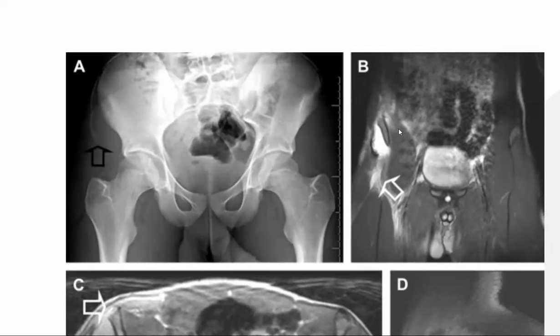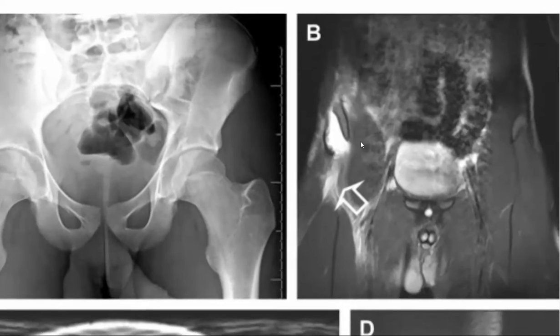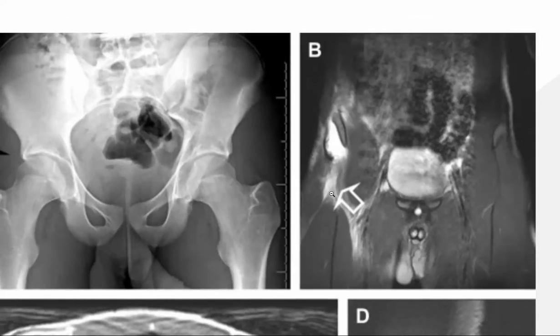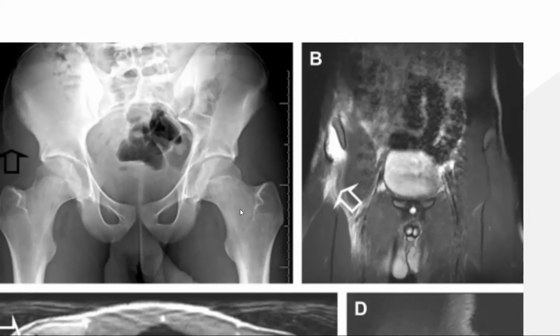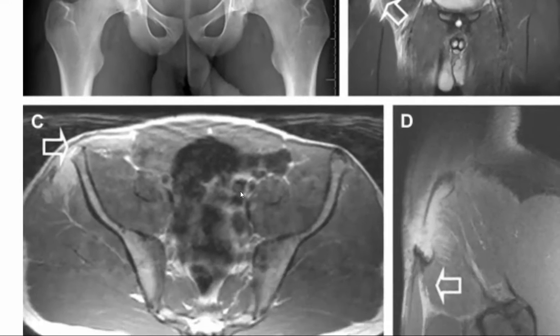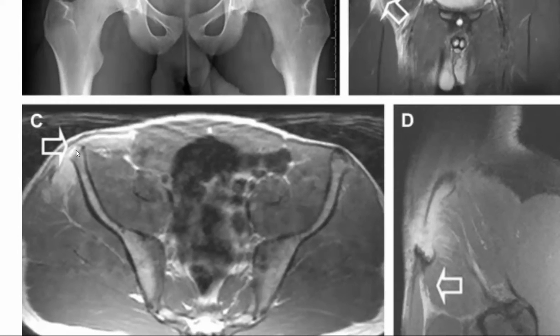So we MRI'd this patient, and you can see quite clearly how there's a large fluid filled gap, and there's a sort of apophysis which is avulsed off, and there's lots of edema extending around the muscles. Here we are again. You can see that the avulsion has gone here.